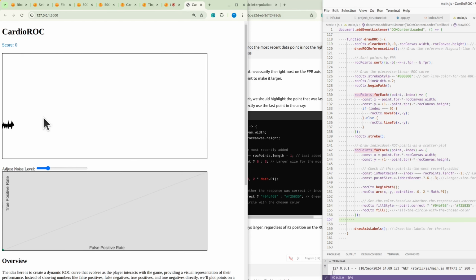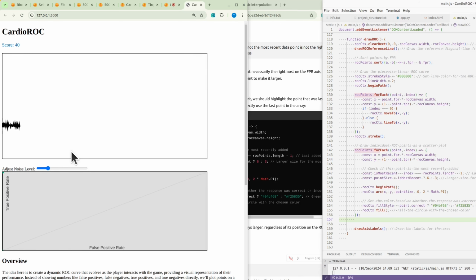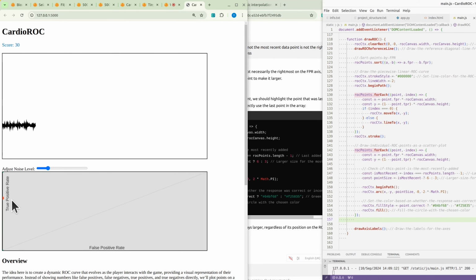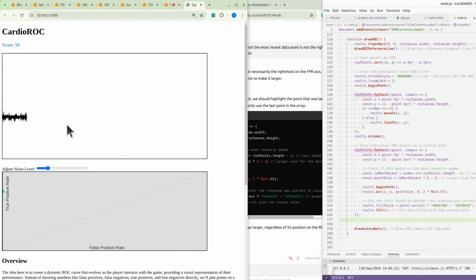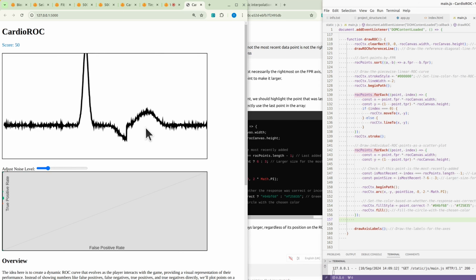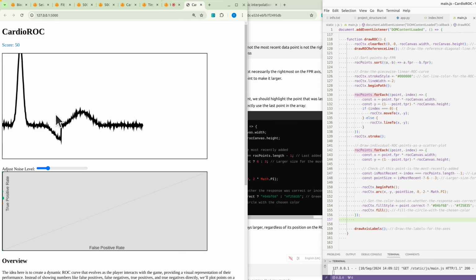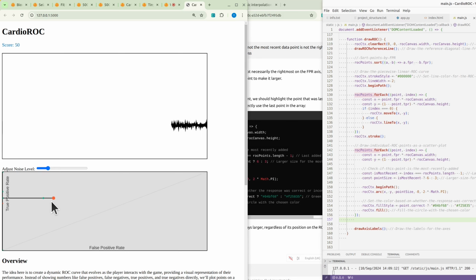This should give us a green. So that should be 0 on the false positive rate. Yeah, that stays there. Now we need a few false responses. So if we don't click on this one, yeah, we get red. If we don't click on that one, we should get another red. Sorry, it should get green. No, that was correct. Okay, we need to click on it, should be green going up. Yeah, if we click on one of those, we don't click on that, should be green.